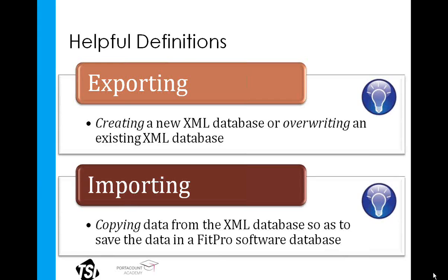Importing is the act of copying data from the flash drive, the XML database, and putting that data into the FitPro software database. Note that importing does not remove data from the flash drive. And we're going to get back to why that's important later on, but it's more of a copy function.